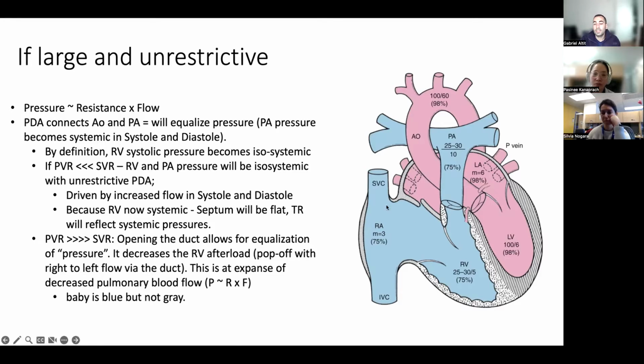Other reasons why you would see a higher right atrial pressure are, of course, if you have high volume coming back from the SVC or IVC. So we spoke a bit about the AV malformation that can bring back a lot of torrential blood flow to the right atrium. You can think of, if you have a clot. So let's say you had a catheter and you have a clot here. Let's say you have a constrictive pericarditis. That's more in the context of patients with cardiomyopathy, or patients who have, I don't know, radiation exposure or cancer or lymphoma.